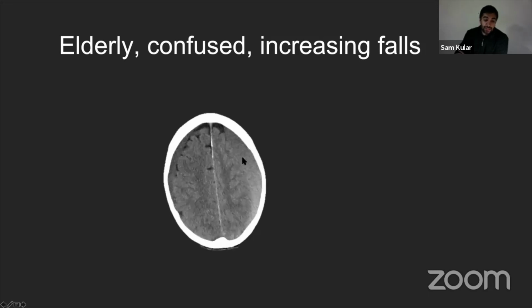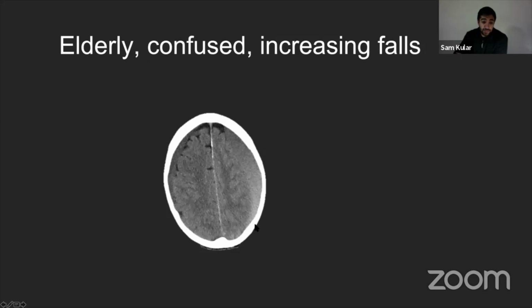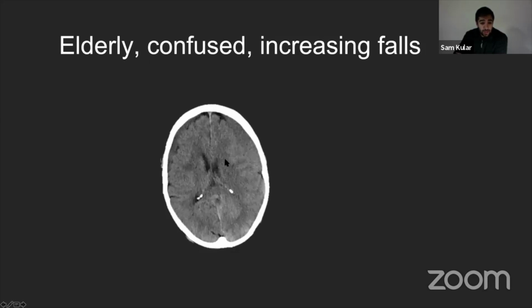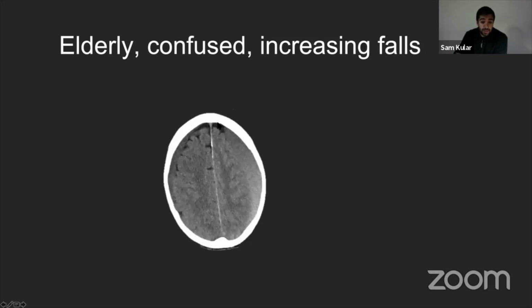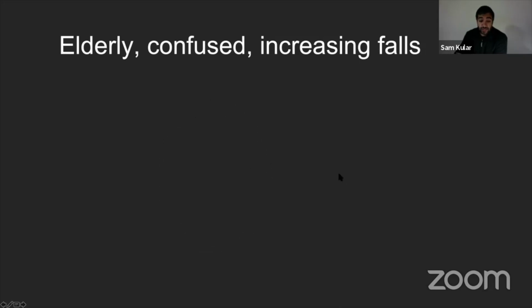It's not quite bright. It's not quite dark. And so this patient may have had an acute on chronic subdural hematoma that's developed after maybe a recurrent fall. A lot of patients will often have chronic subdural collections long-term, but then it may be recurrent falls that they acutely bleed and make those collections larger that then cause them to go to hospital. But many patients can function if they have small subdural collections still.